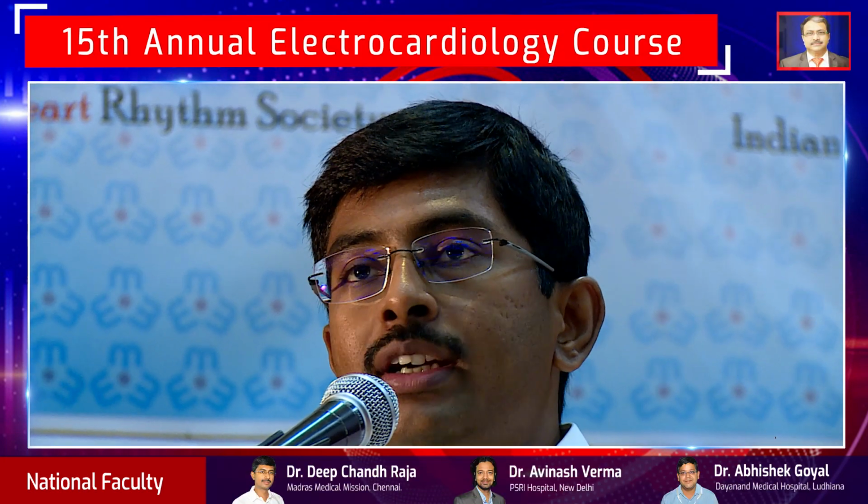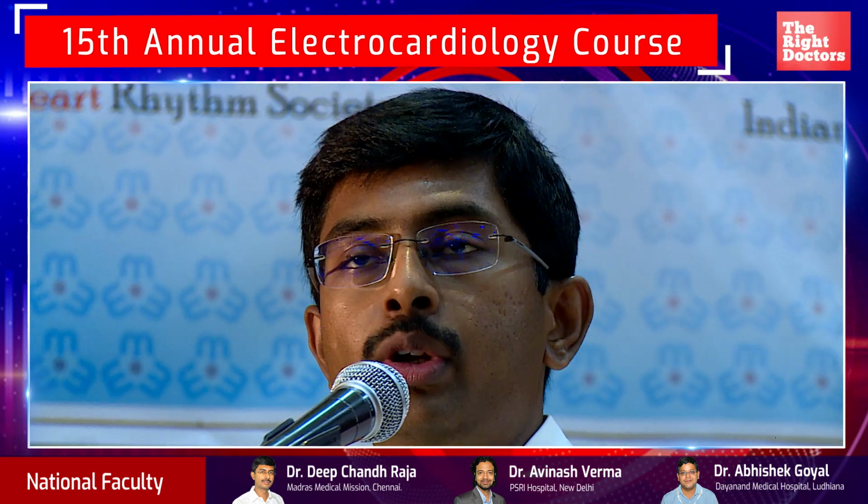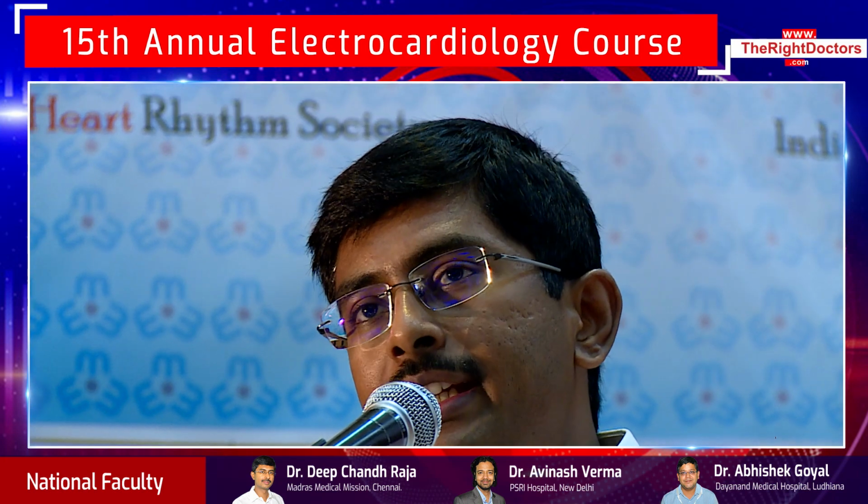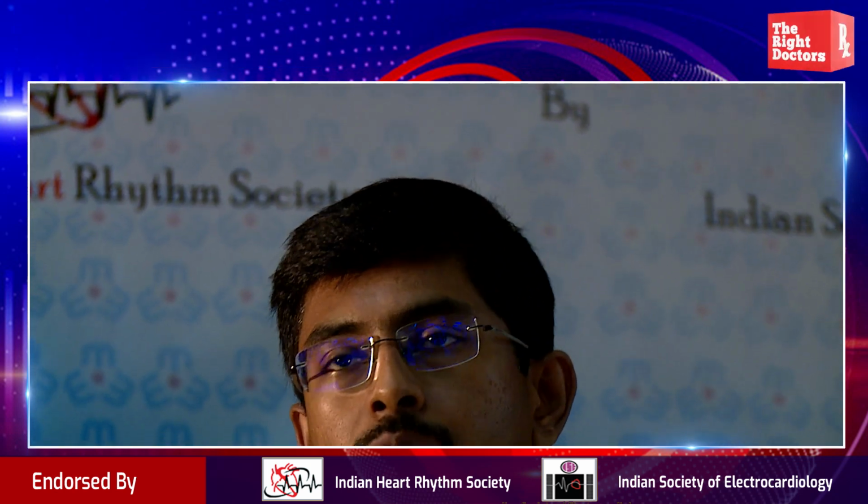That was the reason that we put up and termed it abnormal low and high voltage complexes. Whenever you read an ECG as a physician, whenever I prepared this presentation, I thought about what I did when I was doing my general medicine. The most striking feature of an ECG or 12-lead ECG would be whether you're looking at a low voltage complex or a high voltage complex, small complexes or large complexes, small P waves, large P waves, small R waves, large R waves.